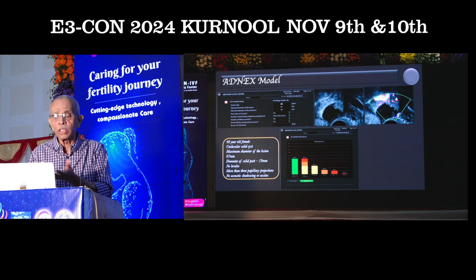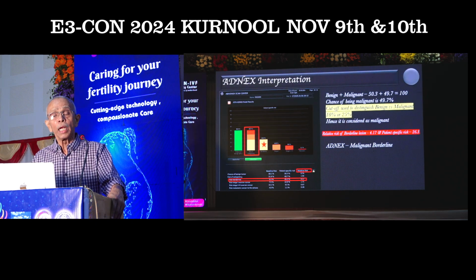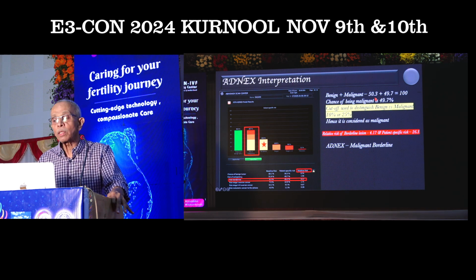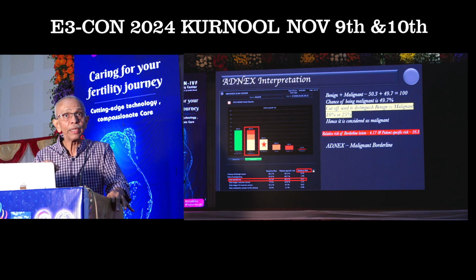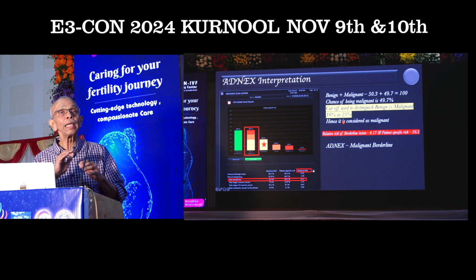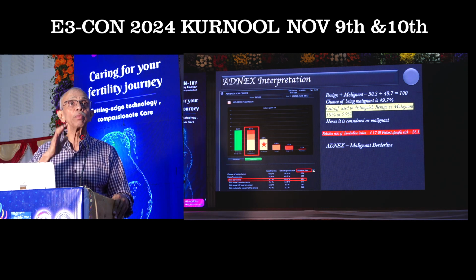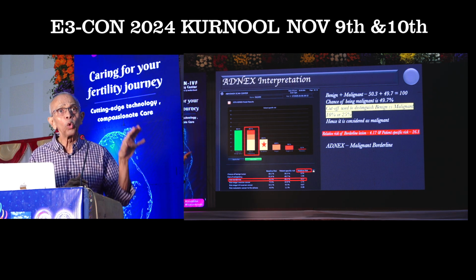Okay, it's fine, wonderful, it's looking very colorful also, but this is the way we are going to identify these lesions. Now here, for the same patient, it indicates that almost 50.3% of these lesions are categorized as benign, but 49.7% of them are considered malignant. Now let us get to the patient-specific risk. Whenever we come to the patient-specific risk, we take the cutoff as 10%. Anything more than 10% is considered to be malignant. Anything less than 10% is considered to be either intermediate or low risk for malignancy.